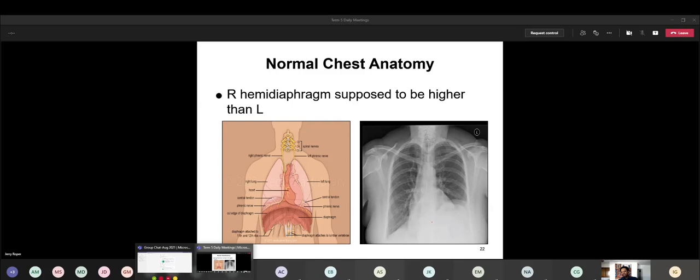But is this maybe extra adipose tissue? It could be. That's what's causing all this blending and blurring that's going on here. Otherwise, we say maybe that's fluid. Maybe there's a buildup of fluid in the abdominal region. And again, fluid shows up as white. And anything behind it is going to get pretty much shadowed out.